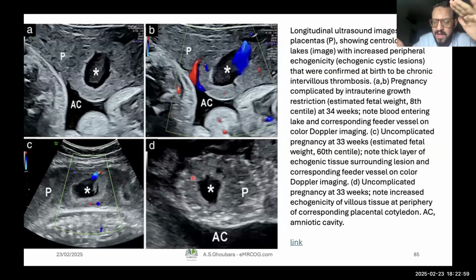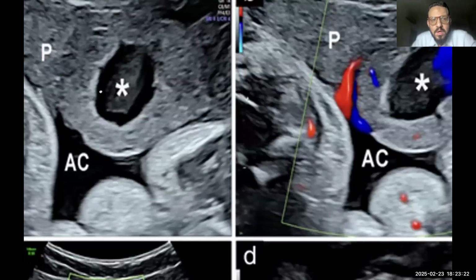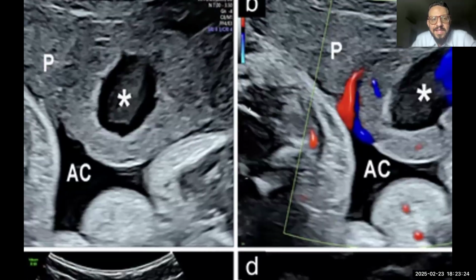Okay. So a couple of slides left in this article: lakes versus lacunae, because they talked about many of them in a big paragraph like this in this TOG article. These are the lakes. Of course, it's clearly different from the lacunae. They're smooth, maybe one or two, and if I zoom here, they have this white line contour.